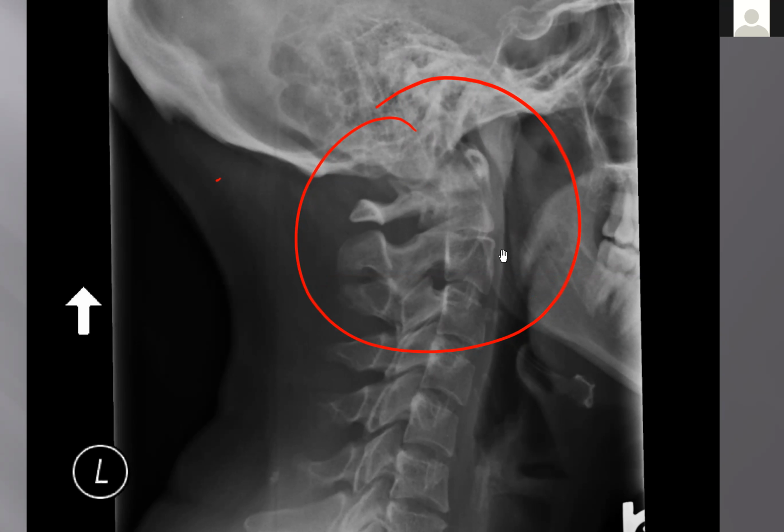Borders. Very good. I agree that the borders of that lucency there are very well defined. They're very smooth. They're very sclerotic. And then there's not a lot of inflammation here. I mean, I can tell you there's not a lot of inflammation. You say, don't you need an MRI for that? Well, kind of. But what's a good secondary finding here that says, you know what, there's probably not a lot of swelling going on here?